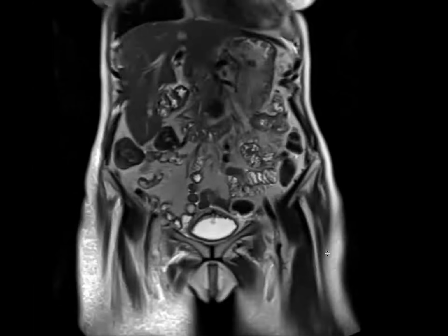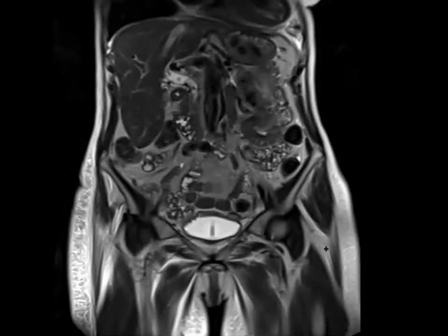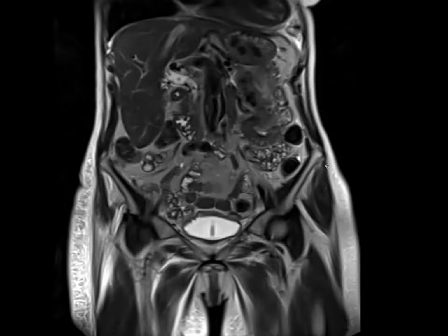Now, this is a little bit difficult on this sequence, but I can show the arterial sequences and the arterial map, and that makes it a lot more straightforward. Do you guys want to venture a guess, or do you want me to move to the next sequence?